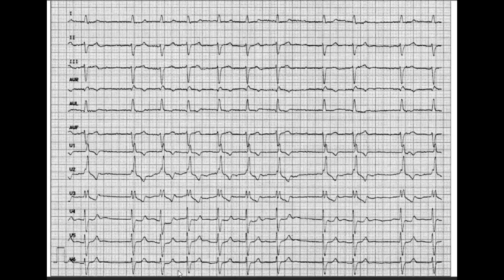So the pathologies in this ECG: atrial fibrillation, which is explained by the irregular action. Second thing, we have the bifascicular block, the right bundle branch block, and the left axis deviation. And the ST changes and the T wave changes can be summarized in the pathology as disorders of repolarization. And yeah, I think that's it for this part.